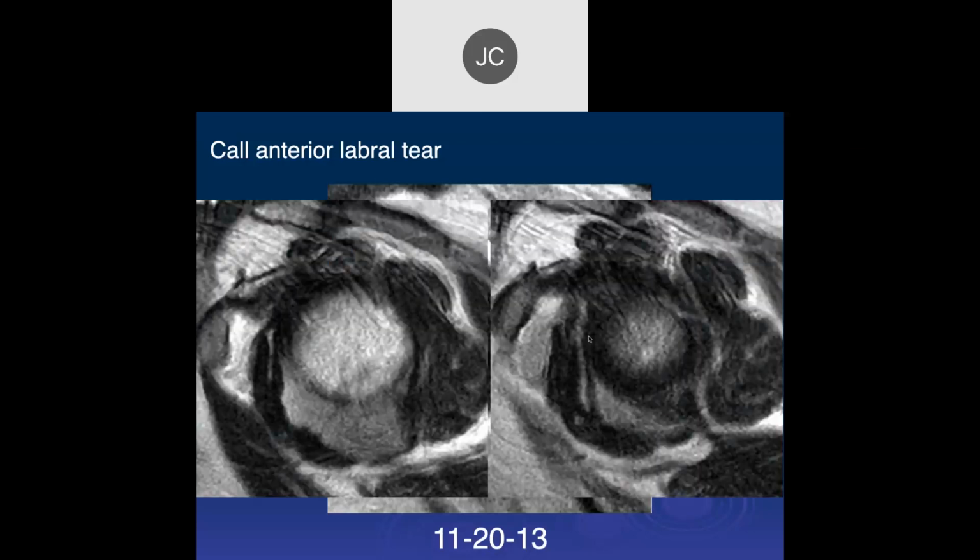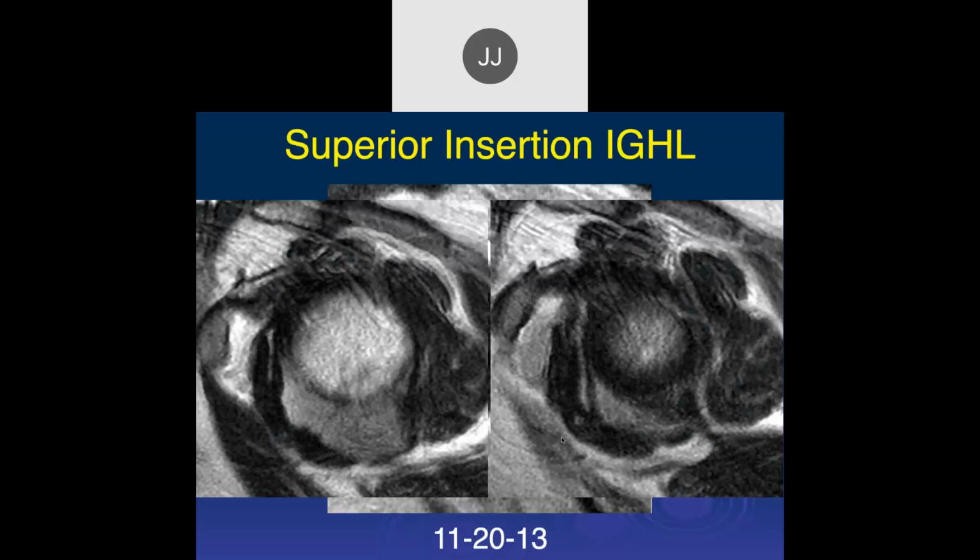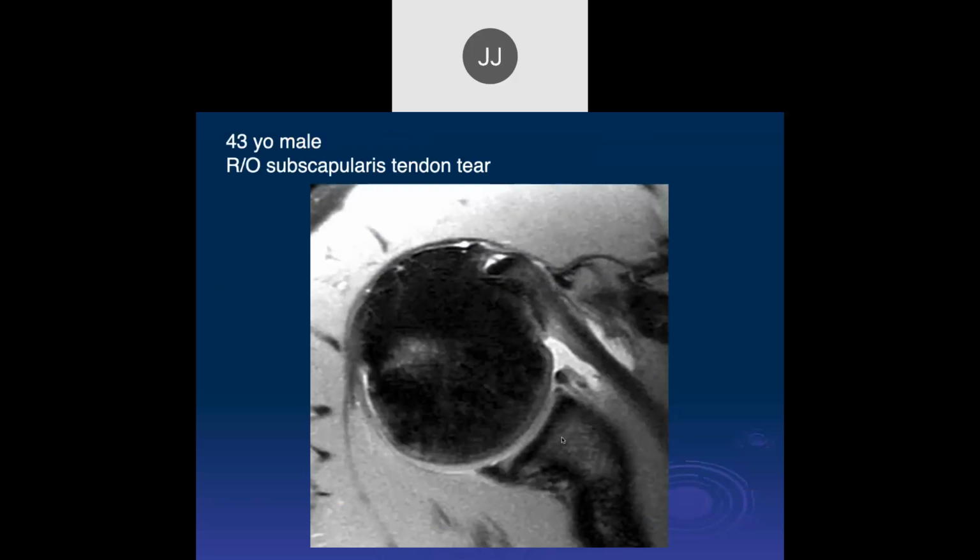And the locations of the ligaments can vary quite a bit, can't they, John? They can. That's right. Okay. And it's not common to see that in women in this location, unless they have a husband that beats them.